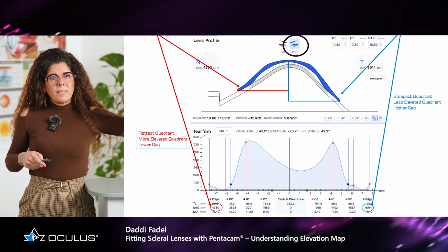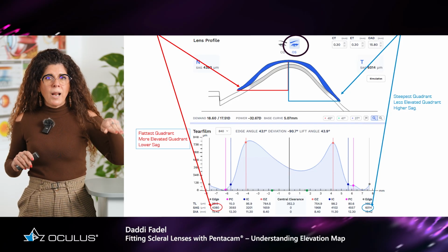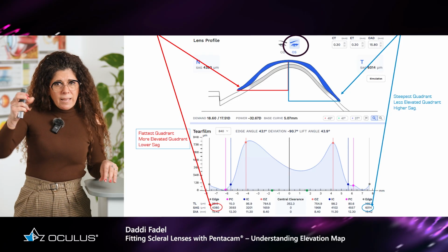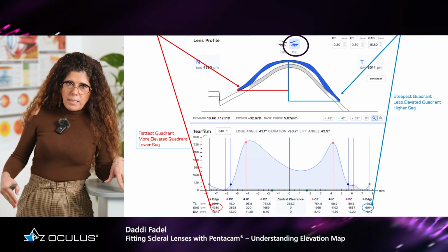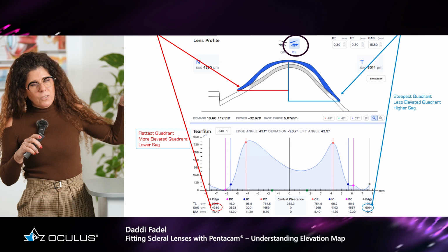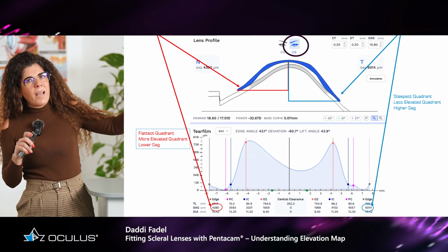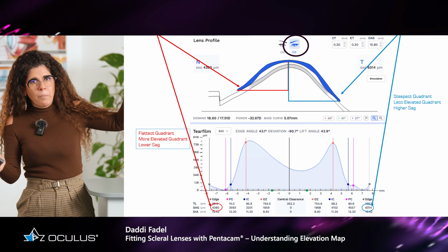And we will see this in keratoconic patients, like in this one. Again, you see between the temporal and the nasal, the temporal quadrant is the steepest meridian, and you see how the sagittal height is higher compared to the nasal one, which is the flattest quadrant. So here you can see why the sagittal height is different between both of them, while the nasal area is higher in elevation, and you can see it because it's similar to our mountain.